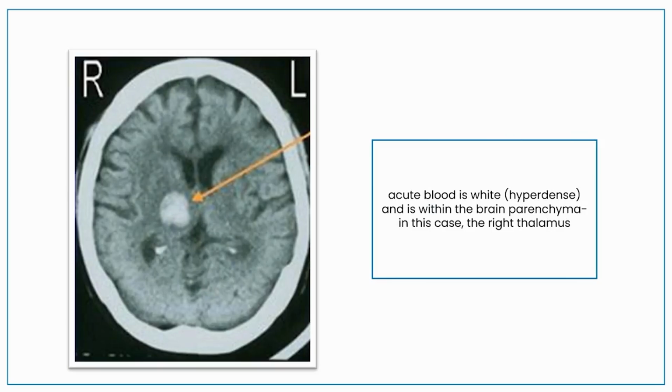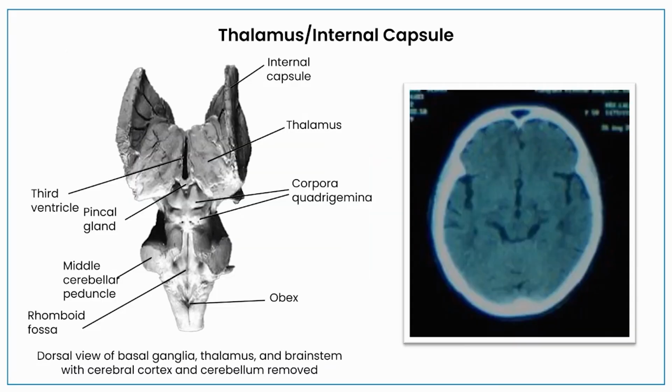Right? So what's the main point to remember? This anatomical structure. This is something which you need to keep in mind. There is a brain stem, which starts from medulla, then comes pons.